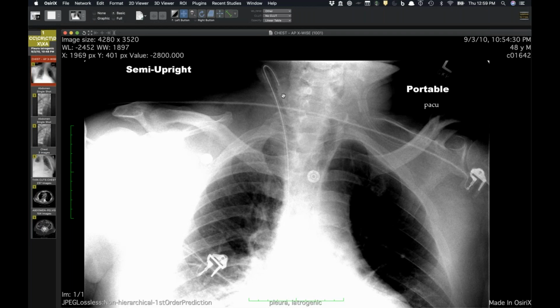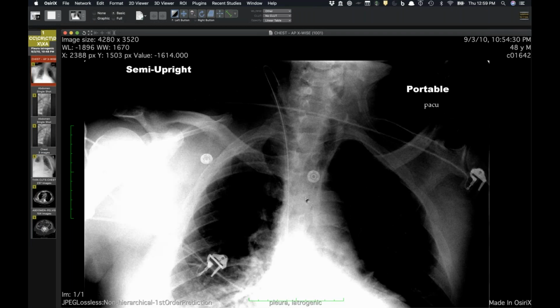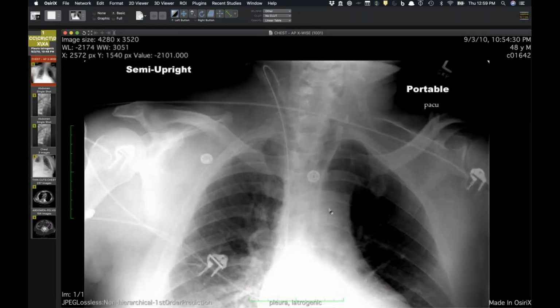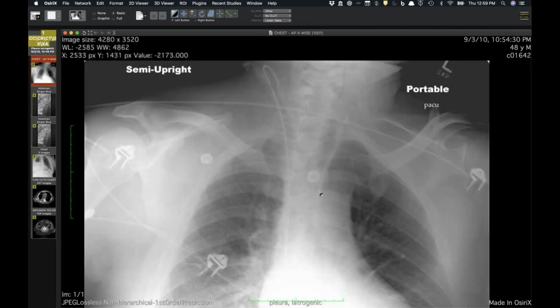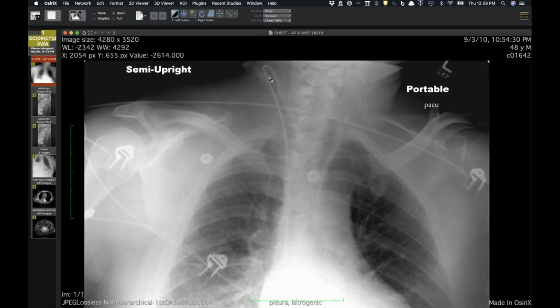So this was probably left behind at the time and not recognized. But I don't think prospectively, if you just see this for line placement, I'd probably comment that there's still a wire, not knowing that it may be sucked into the catheter at this point. But apparently this had been there for 9 years before it presented with anything, assuming this is the culprit.